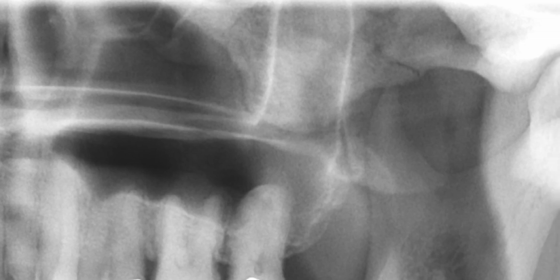And that's what we see. Although it's not quite radiolucent, we see an opaque border and maybe a thin radiolucency just next to that, inferior to the opaque border, but this line pretty much coincides with what we saw on the contralateral side, except the other side looks a little more radiolucent.